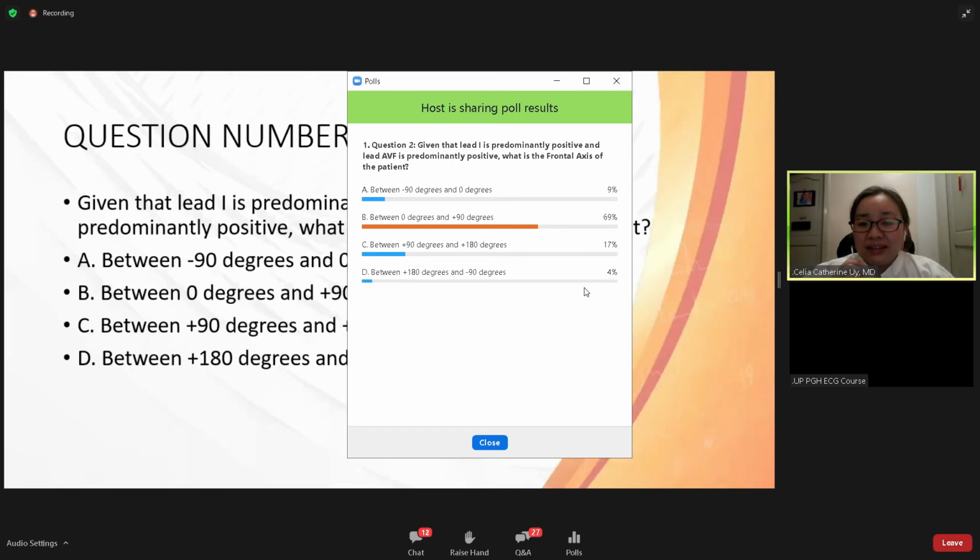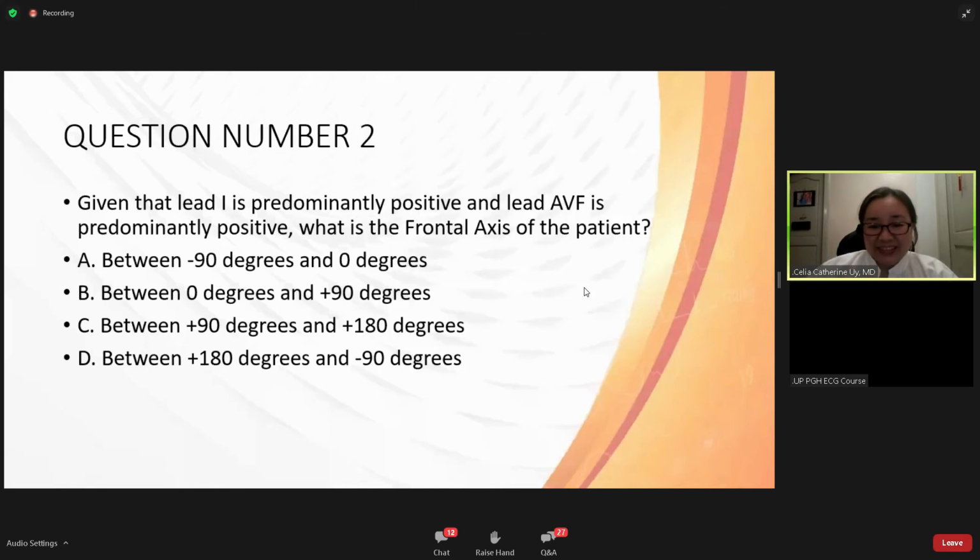And that is the correct answer. So let's just go back to the ECG.